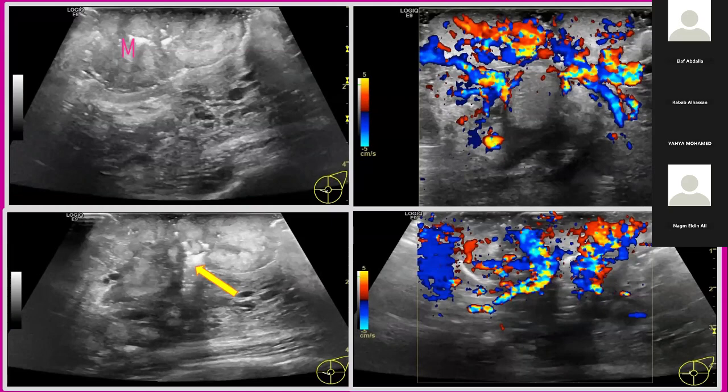There is a communication between the tissue outside and inside the breast, as you have seen here, associated with edema and even vascularity. Look at this vessel passing from the inside, intramammary, to outside into the mass. So I was so surprised because it was my first experience to see a breast hernia. I asked the lady, do you have any trauma? She answered me that yes.